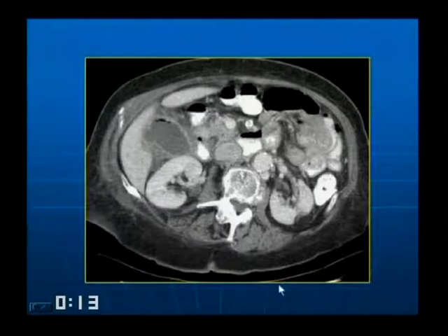I love it. Emphysematous cholecystitis. When asked if the patient is diabetic, you can actually see air in the gallbladder. Couldn't the gallbladder be hydropic in cholecystitis? Well, not necessarily in emphysematous cholecystitis, and certainly not if the patient has perforated. There's already fluid, and there's maybe been perforation, so the distension of the gallbladder may not be present. And in emphysematous cholecystitis, most of these patients are diabetic. The gas can occur both in the gallbladder wall and in the lumen of the gallbladder.